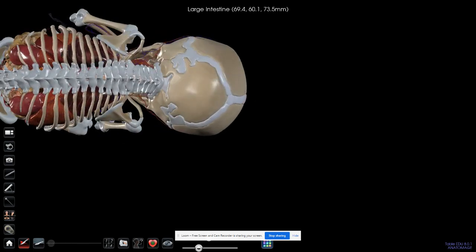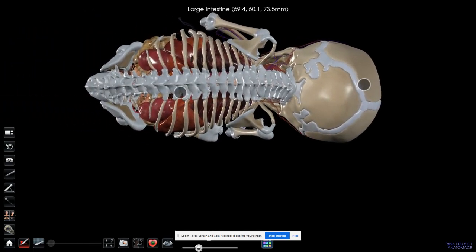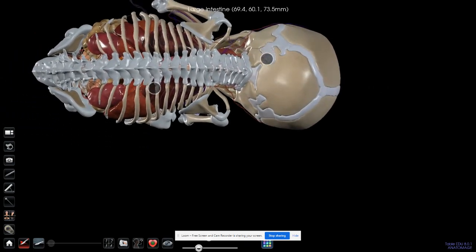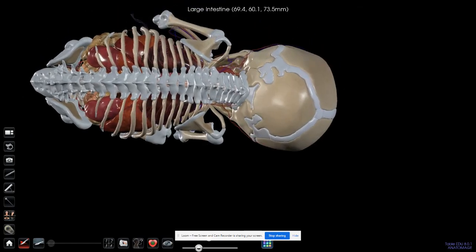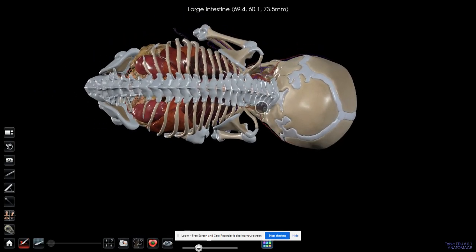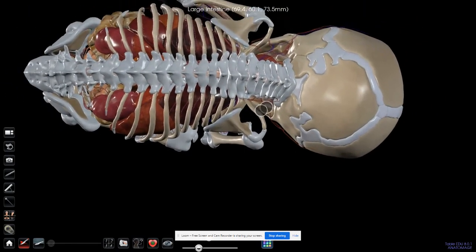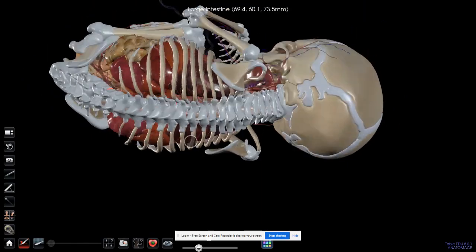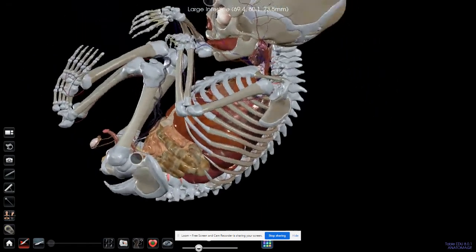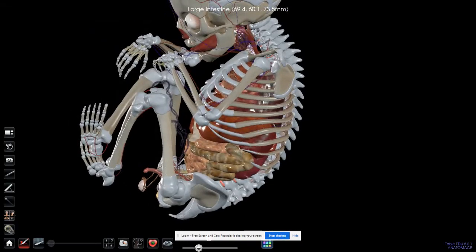Say I want again to move the 3D printed image cadaver organ. You use the two different fingers and the two different hands. If you want to zoom in and zoom out, you pinch. If you want to rotate, you use one finger and rotate the direction that you want. Sometimes two. If it's like this, I'm spinning it and it's huge.